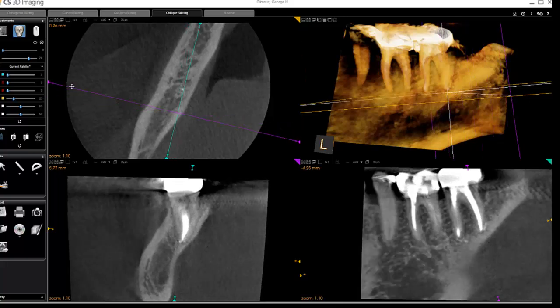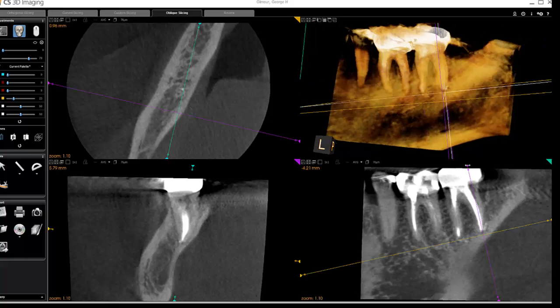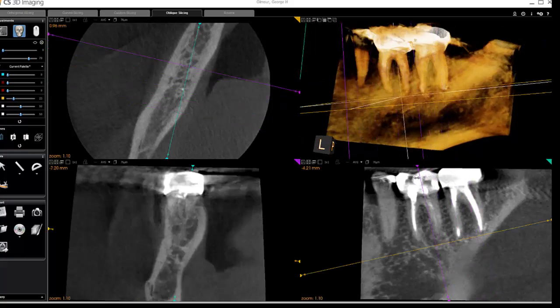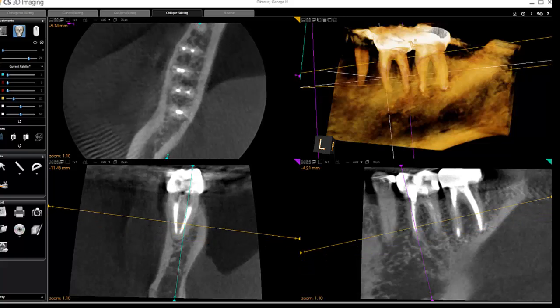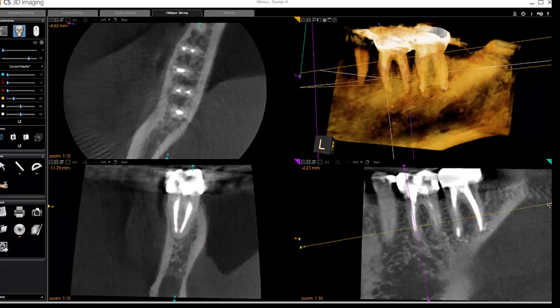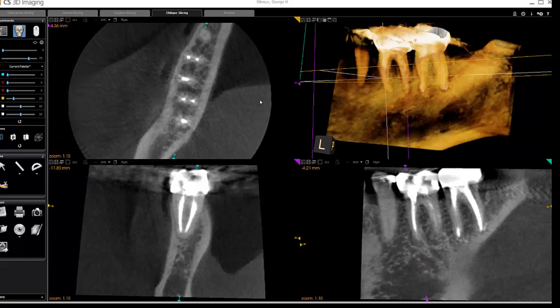Now, by contrast, let's look at the mandibular first molar. Start off, let's drag the transverse plane up so we're catching at least the apical portion of the mesial root. The transverse plane section you can see right here is very interesting. That gives you a good view whether the canals were filled symmetrically down the center of each root. If you see any asymmetric positioning of the radiopaque material, that might mean there's a missed canal or some additional anatomy that may not have been treated.